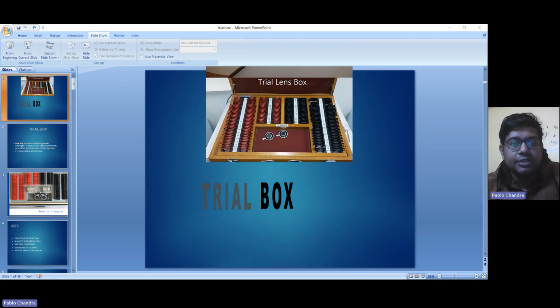This is a half eye. You can see half eye lenses can be used. A half eye trial frame with a nose piece for children has a PD of 54. PD means pupillary distance; from one pupil to another pupil distance is normally known as pupillary distance. A PD of 54 to 58 is also available with fixed bridge and adjustable nose bridge.